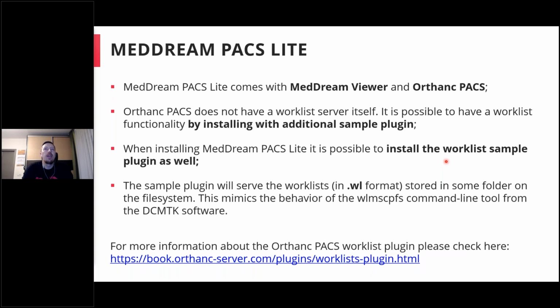And if you download and install our PACS Lite package from our website, you will have the option to check mark and install this sample plugin as well. Basically, you just double click the exe file, click next, and it will install the MedDream viewer, Orthanc PACS and this worklist plugin.